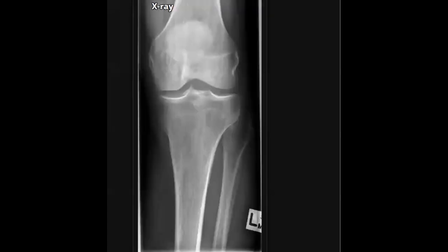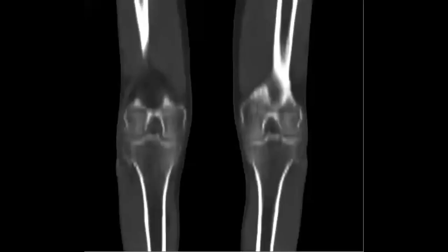Everyone agree? Do you have any lytic or sclerotic lesions? Yes, most is normal. For such reason, they suggested to do CT. Actually, this patient did this low resolution CT, and they didn't find anything.